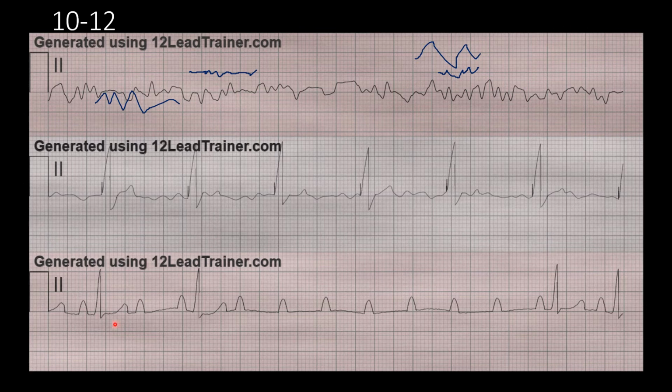Now, the second one, hopefully now, you will have this one down too. So we don't need to go through the interpretation steps because of these little vertical dark lines right here. So once again, we have a ventricular pacer, because right after it we have this wide QRS looking thing. And with this, it does look regular, and there doesn't appear to be any failure to capture or malfunction, so it's a normally functioning ventricular pacemaker.